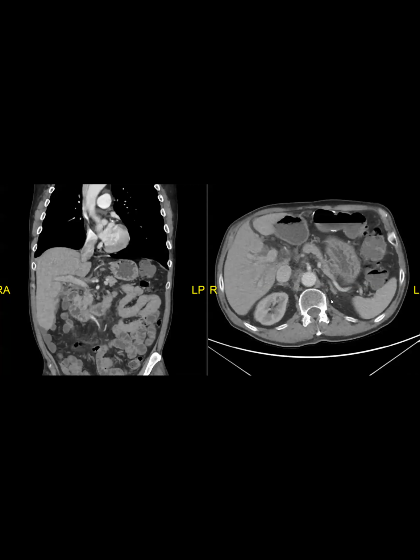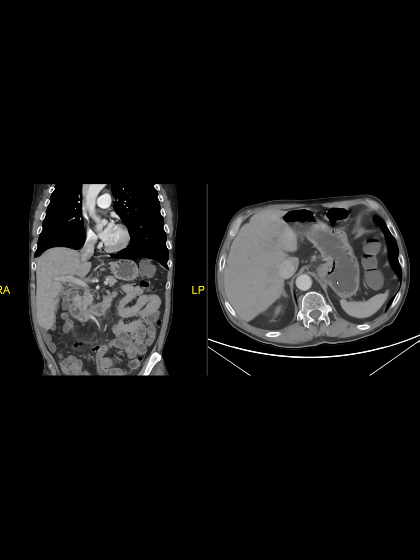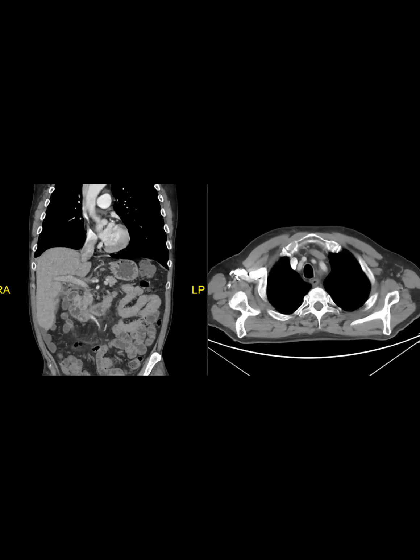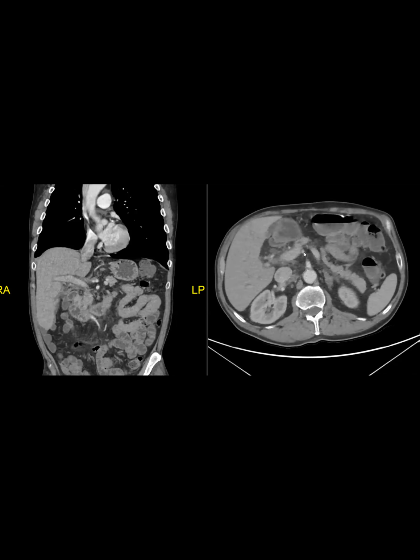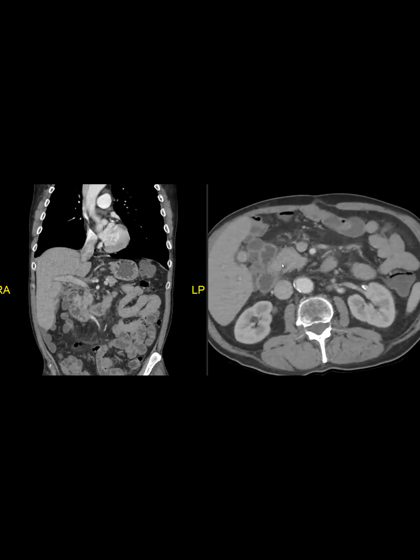Okay, so this is a patient who has past proven metastatic colon cancer. The metastasis was in the chest, on the supraclavicular node. So this was already proven to be colon cancer, and this is an outside study for staging. And so I was reading this.